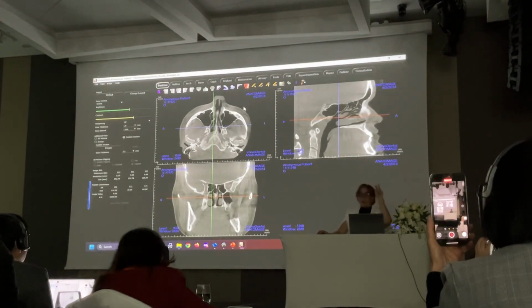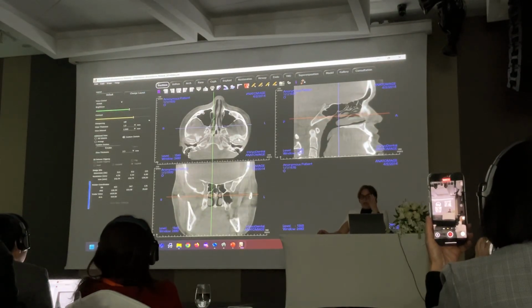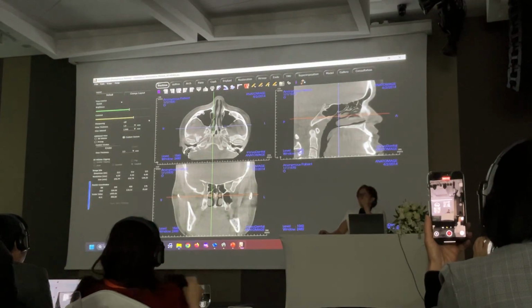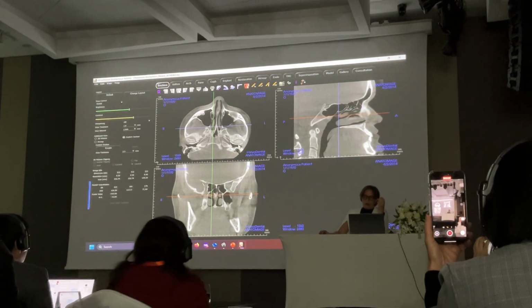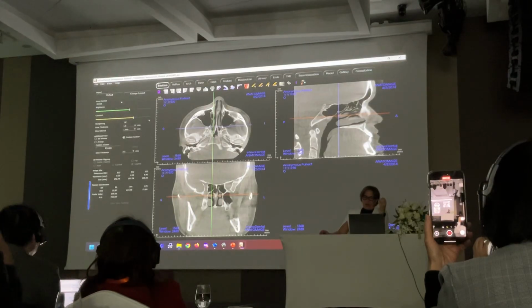First important thing. Second important thing is you're going to reorient the scan so that you can bring the anatomical structures in the same plane. So you see how this looks asymmetric? We are going to rotate the scan. So what are we going to use? In these larger fields of view, you use the external auditory canals, which are these black lines right here.